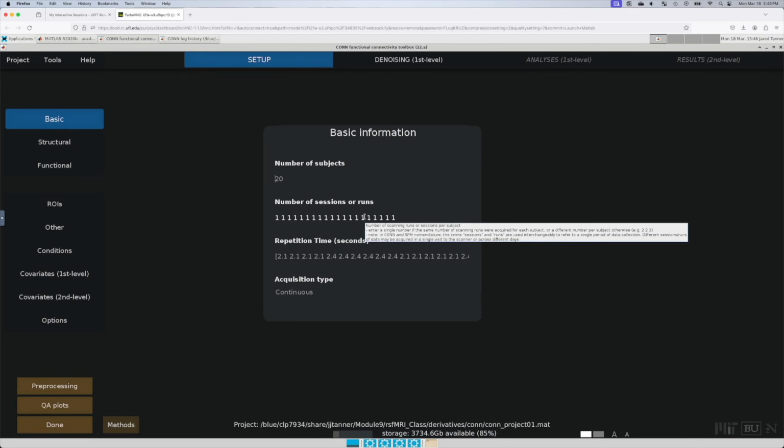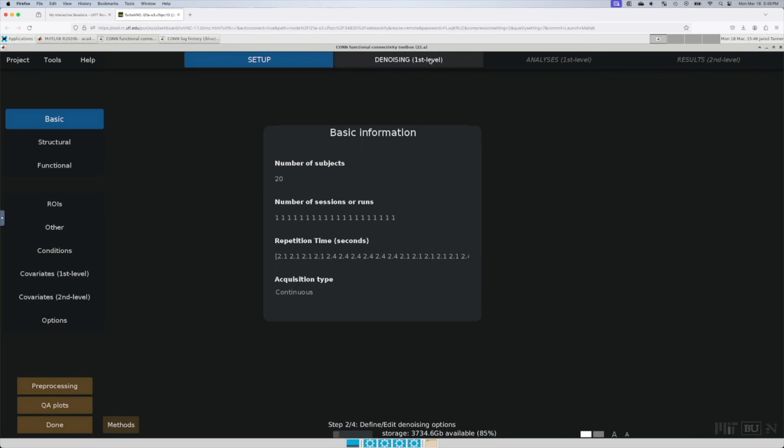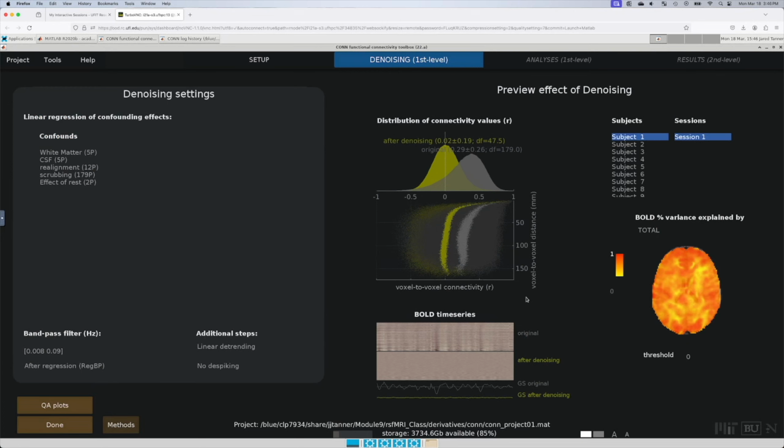But we shouldn't necessarily keep everybody in because of how the things are being processed. But this is for class. I'm not trying to publish this.